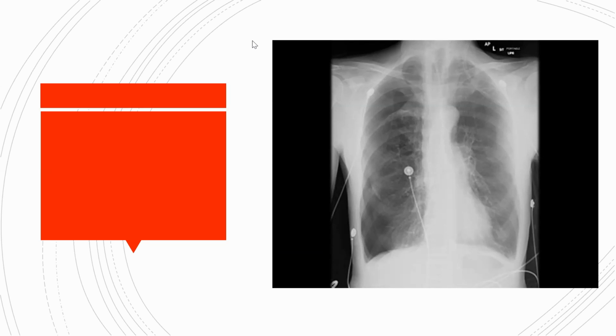Great, perfect. So you guys have seen, remember to keep your eyes out, because the pneumothorax I showed you at the beginning was obvious. It was like the lung was completely shrunken. But here it is very snaky. But actually, when you think about it, it's not that small. It's at least 3 centimeters. So you would want to do something about that pneumothorax, even though it's not completely shrunken. It's still 3 centimeters, okay?